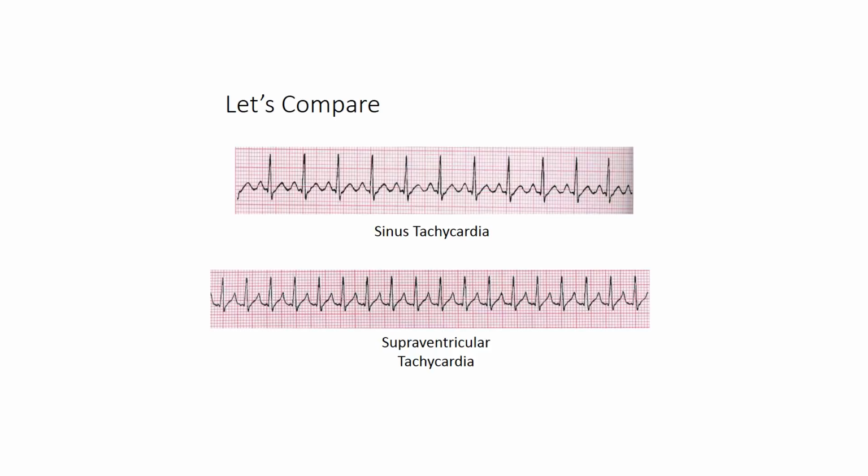So the rate for this strip, when I look at the ventricular rate, is 180 beats per minute. There's 18 R waves here. And it's too fast to figure out what's causing it. But I do know that the atria are at fault because by process of elimination and looking at my QRSs, those are normal. They're less than 0.12 seconds. So I would call this a supraventricular tachycardia.